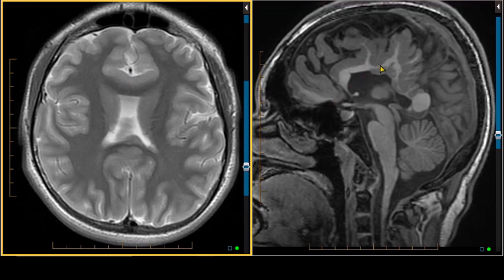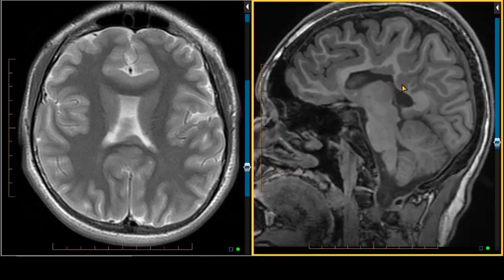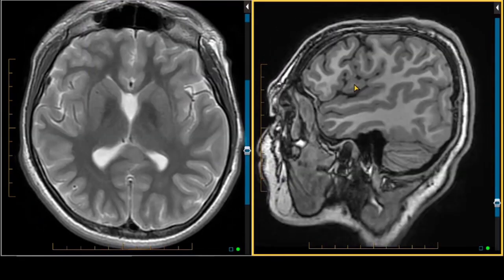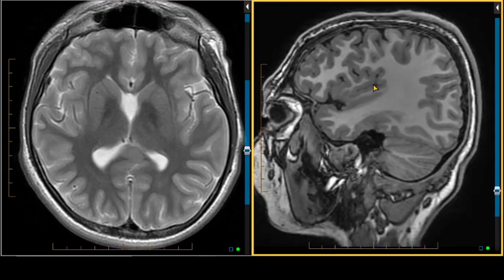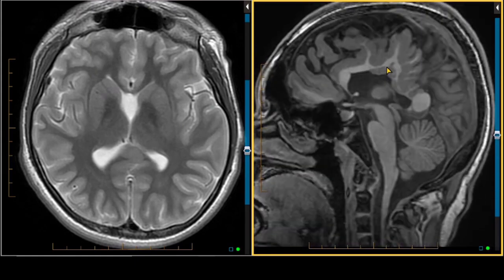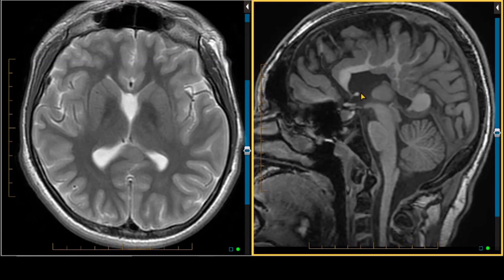Well, in this sagittal image, we see segmental dysgenesis of the mid portion of the corpus callosum. There's some gray matter heterotopia here, abnormal gray matter in this location. And if we go to the side, there's almost vertical extension of the sylvian fissures here. And this right here is an abnormality that's known as syntelencephaly, S-Y-N, meaning like synapse, coming together of the telencephalon. It's a milder version even of a holoprosencephaly spectrum disorder.